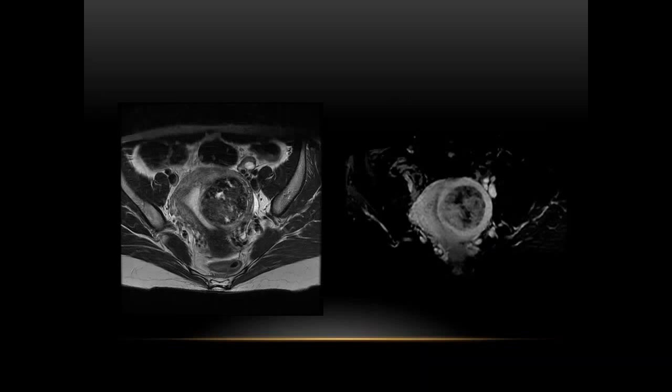A clue that it could be a leiomyosarcoma is rapid growth, growth in postmenopausal women. That's why you always want to compare to prior ultrasound, prior MRIs, etc. Try to compare as best you can previously measured leiomyomas. Another clue is that it enhances greater than the adjacent myometrium, which isn't the case in this scenario. This was a surprise to us that it was a leiomyosarcoma. And then some studies have shown that an LDH level may be elevated in patients with leiomyosarcoma.